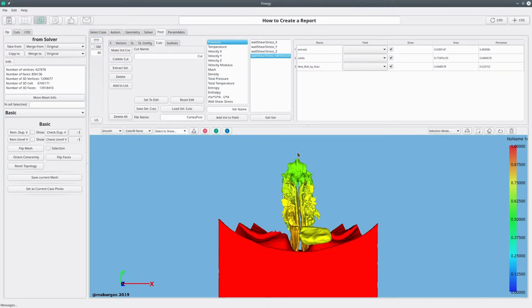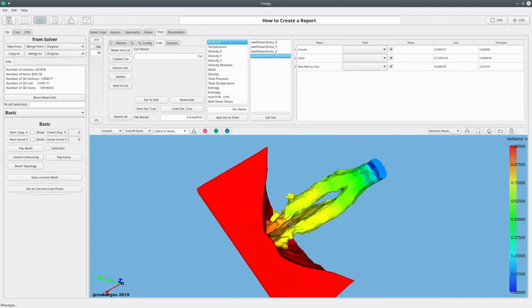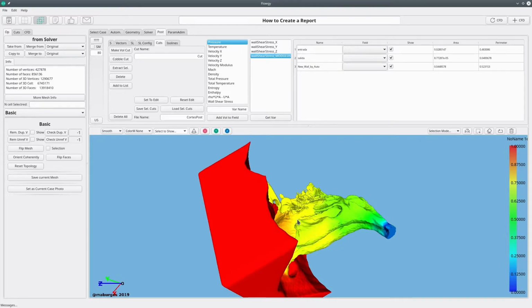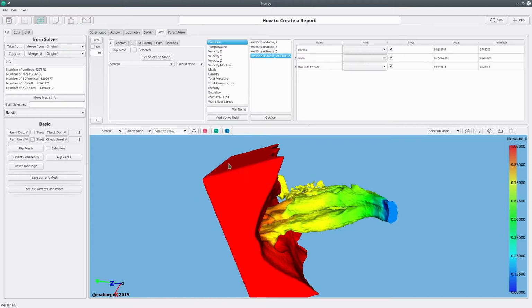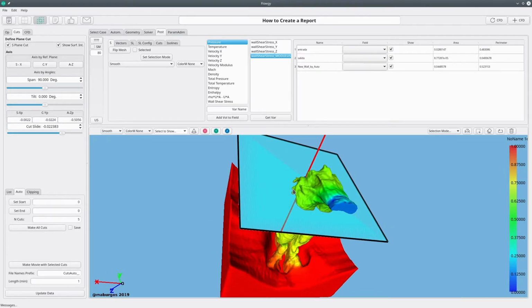Flowgy's post-processing module is a complex workspace where we can carry out a multitude of tasks to complete and provide additional information to the standard CFD solution we have created. Some of the tasks we probably carry out the most are, for example, the creation of cuts in the anatomical structure, to calculate precisely how the flow in those cuts flows, and how that flow affects the structure that we have selected.